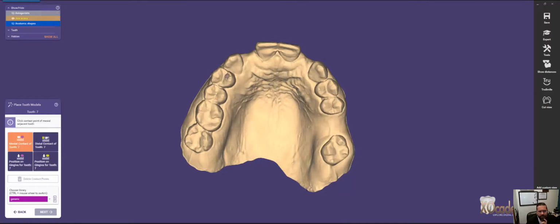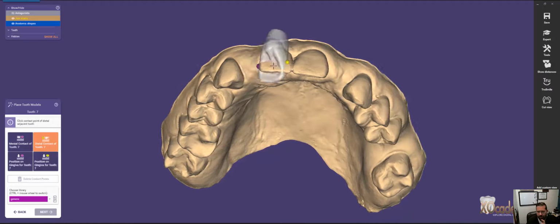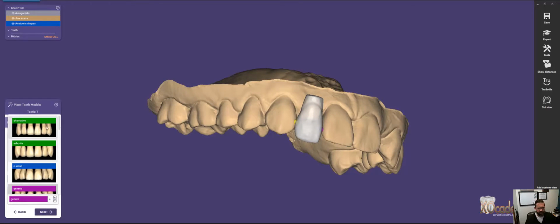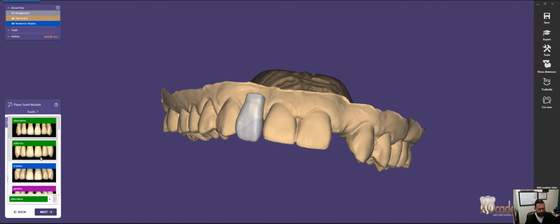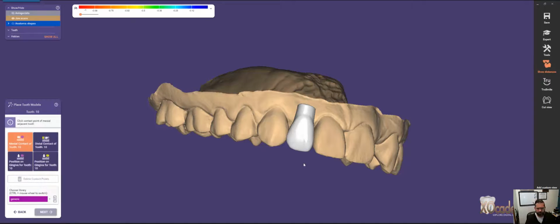So we're going to go through this. If you've done this at all, you're probably somewhat familiar with this. And I might switch this over to HD. We'll see. Generic, alternative, and HD is kind of what I use the most. Yeah, I like HD. Alright. Next.